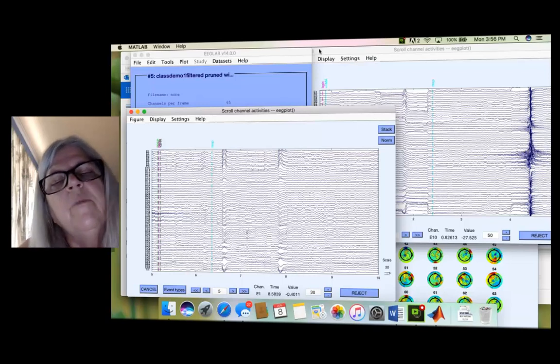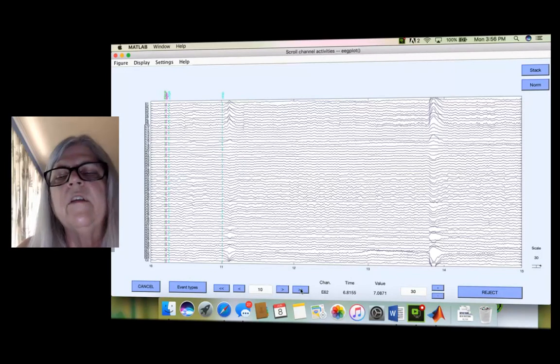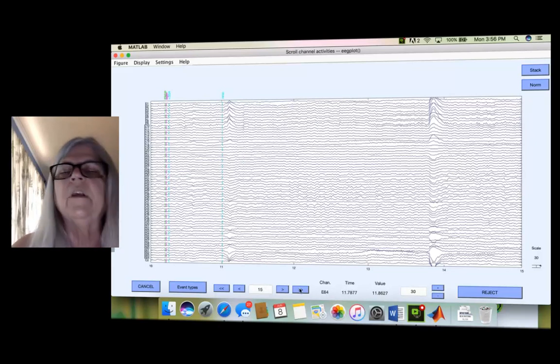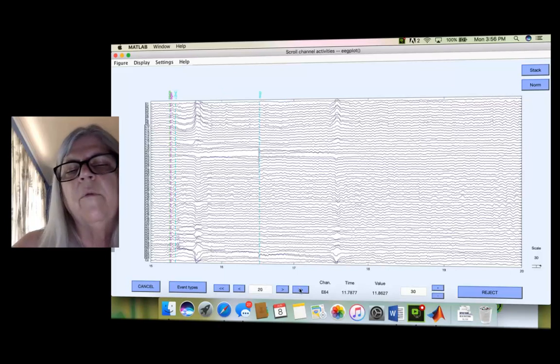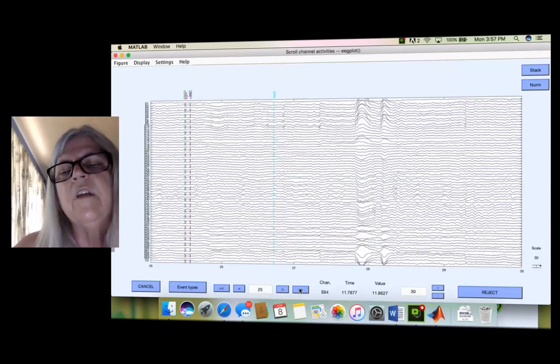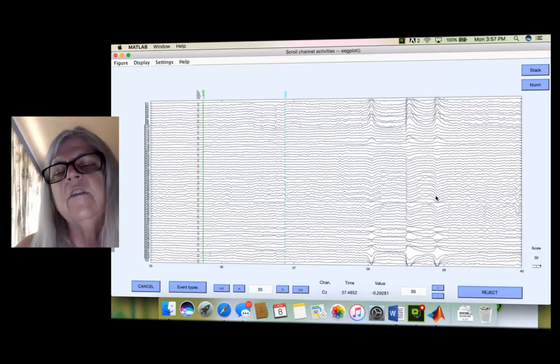So you're going to have to play around with this, trial and error a little bit, and see what the best technique is that gets rid of some of these things. Actually, I'm not terribly concerned about the ones that remain. It's not terrible. They're pretty spaced out. Like I said, this one's maybe not great.